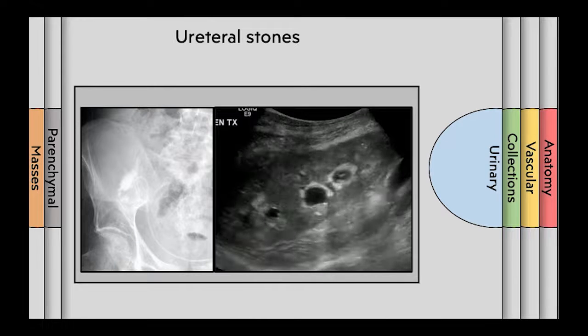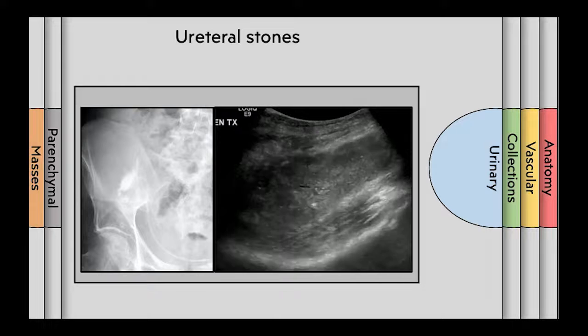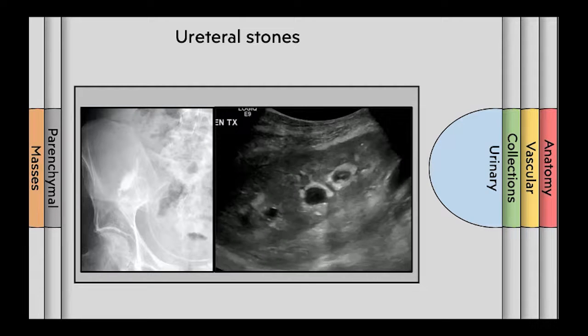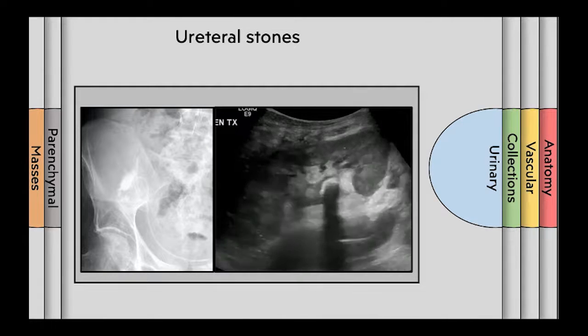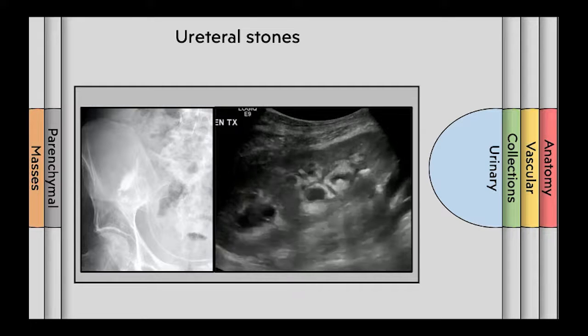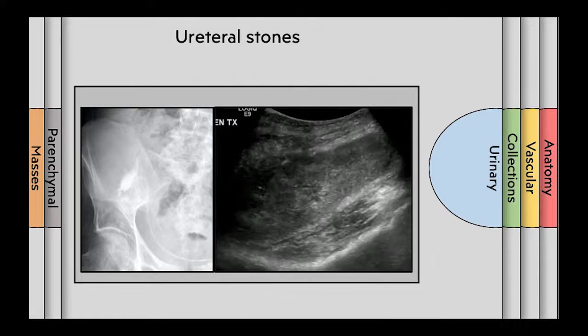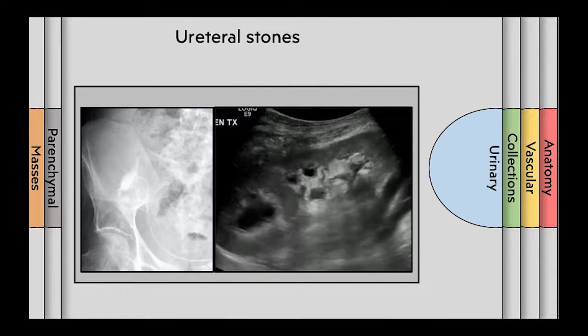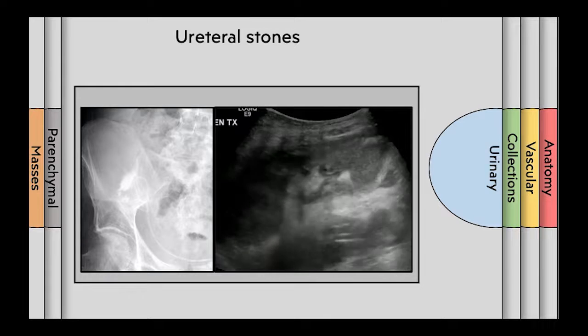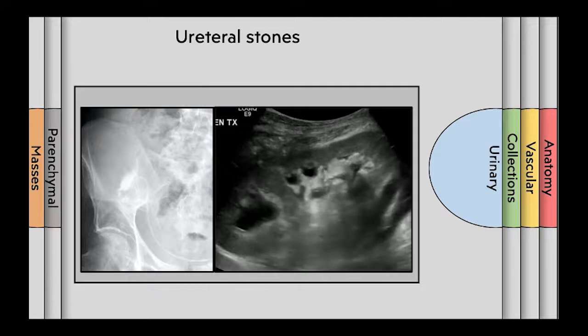Ureteral stones can also occur. They can either develop de novo within the transplanted kidney or can be imported from a deceased donor. In this particular case, the surgery team was unaware that the patient had a staghorn calculus, which was observed on the KUB performed to evaluate the ureteral stent. You can see the shadowing staghorn calculus on the ultrasound on the right.